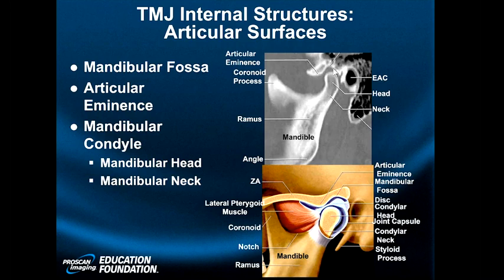In the back, there'll be attachments, and we see an upper and a lower attachment with the meniscus or disc on this colored diagram. The upper attachment connects to a small ridge, which is poorly seen right there, known as the postglenoid process or postglenoid plate area.